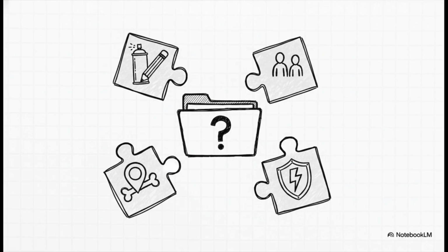The border tells you the growth speed. The age gives you the context. The reaction shows you the bone's response. And the location points to the most likely culprits. You put them all together, and you can create a really powerful and accurate list of possibilities.